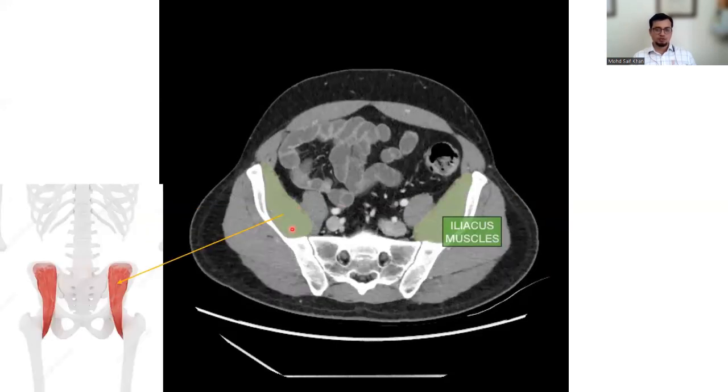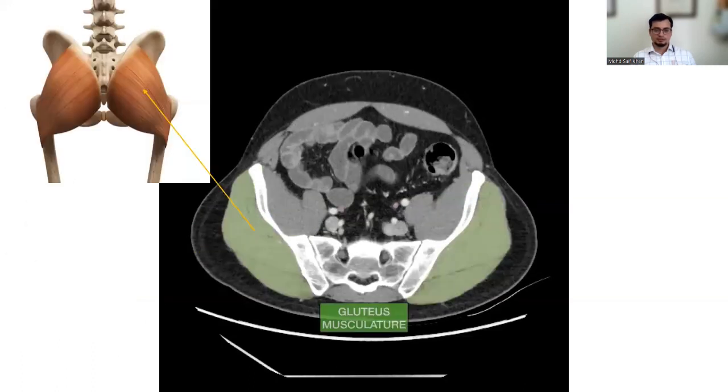Now here you can see one more muscle in the iliac crest. That is your iliacus. Iliacus is a flat triangular muscle, a kind of intrapelvic muscle, and it fills the iliac fossa. So this is your iliac fossa, and it forms the lateral portion of the iliopsoas, okay, and provides flexion of the thigh and lower limb at the acetabulo-femoral joint.